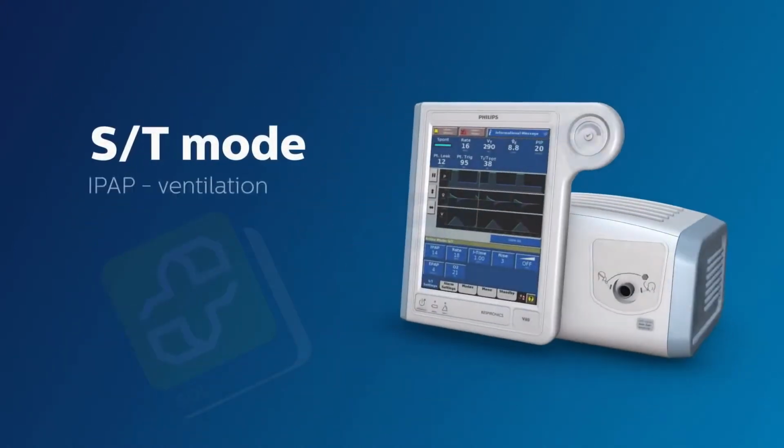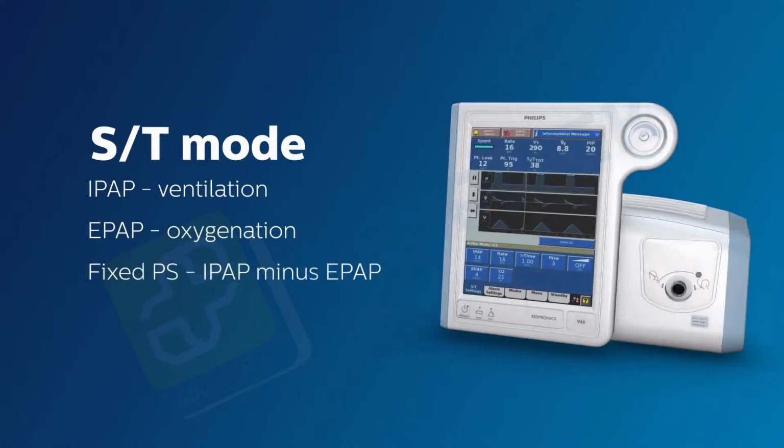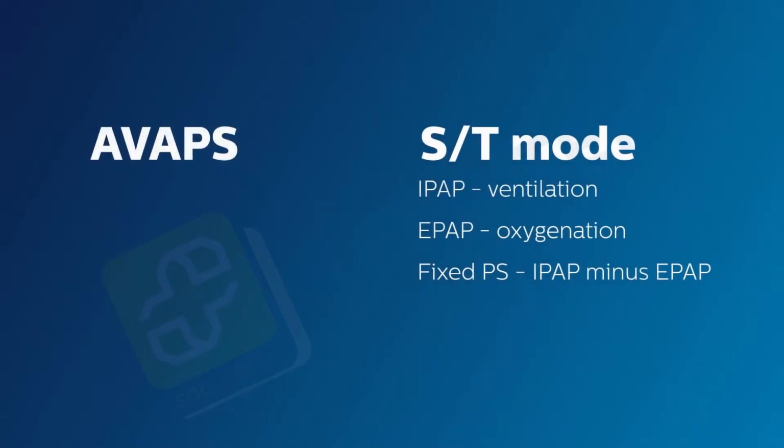In this mode, you have one IPAP setting, one EPAP setting, and therefore one fixed pressure support. In AVAPS, certain features are added. You still have the one EPAP control like in the ST mode. Rather than having one fixed IPAP setting, you now have the ability to set a range for your IPAP, a minimum and maximum IPAP setting. And the IPAP can change by itself within the minimum and maximum range.